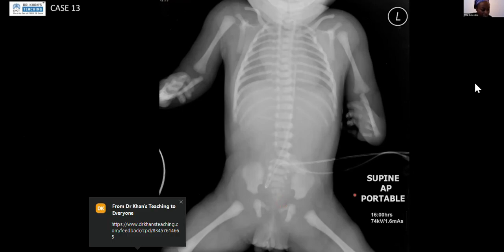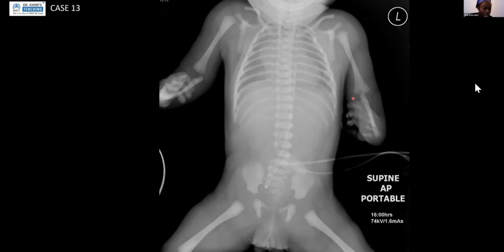Anorectal malformations are also associated, so that's the A in VACTERL, and that's often diagnosed clinically by the surgical team or the neonatal team when they do their baby check. Then C is for cardiac, so we can look to see if the heart appears enlarged, suggesting an underlying congenital abnormality. In this case, the heart is enlarged and the child actually ended up having tetralogy of Fallot as well. If you have tetralogy of Fallot with a tracheoesophageal fistula, then in the UK we call it a double TOF, given the abbreviations.